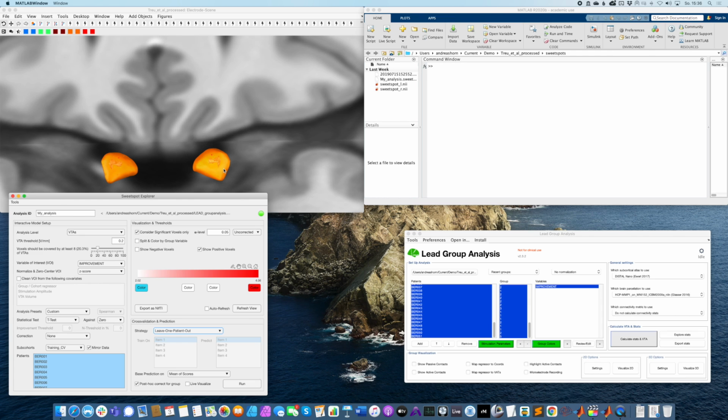Now we can repeat that, leaving out the second patient, and that would again lead to a new model that looks slightly different, and then we can predict that patient, right? And we could do the same using, for example, k-fold strategy, right? If we use five folds, that would mean these selected patients, so not all of them, but the 40 that we selected here, they would be split into random sets of 5.